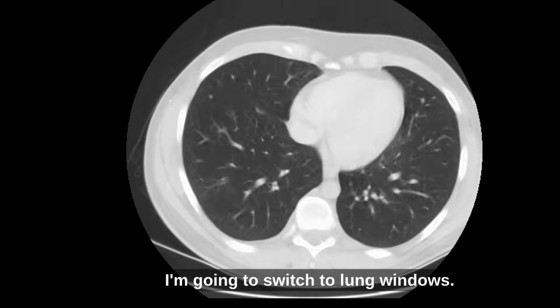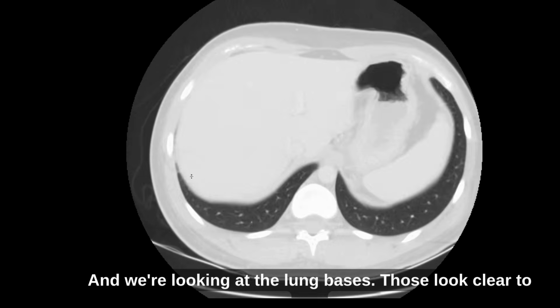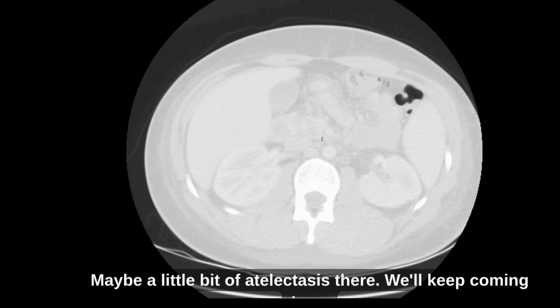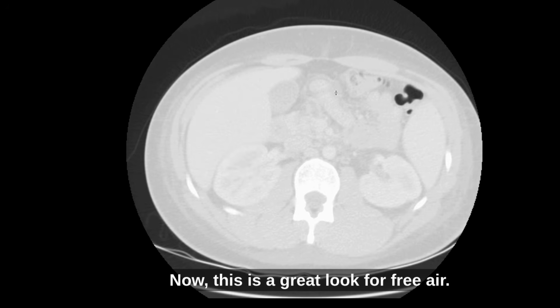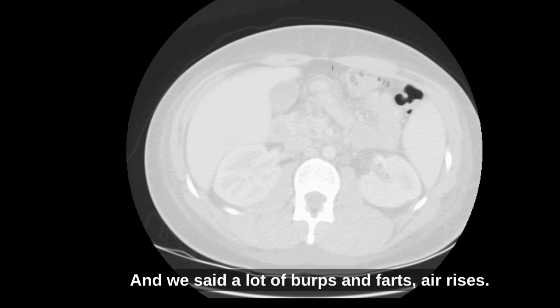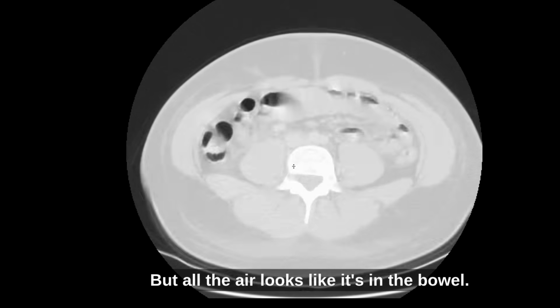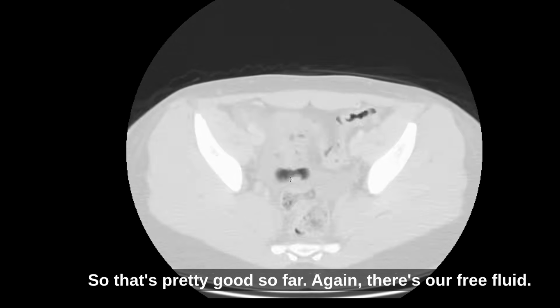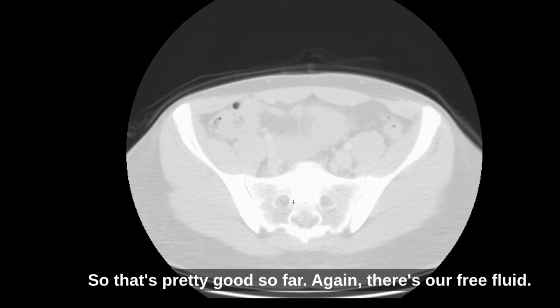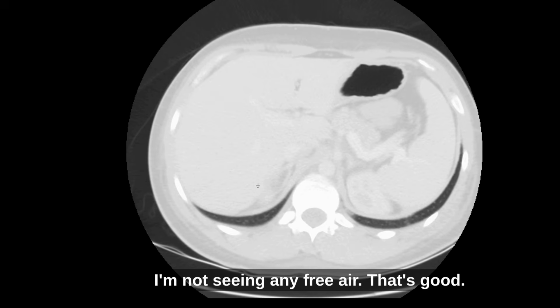I'm going to switch to lung windows, and we're looking at the lung bases. Those look clear to me. Maybe a little bit of atelectasis there. We'll keep coming down. Now, this is a great look for free air. We had a special video about how to look for free air on radiographs, and we said air rises. So if I'm looking for free air, I'm looking up here, but all the air looks like it's in the bowel, so that's pretty good so far. Again, there's our free fluid. I'm not seeing any free air.